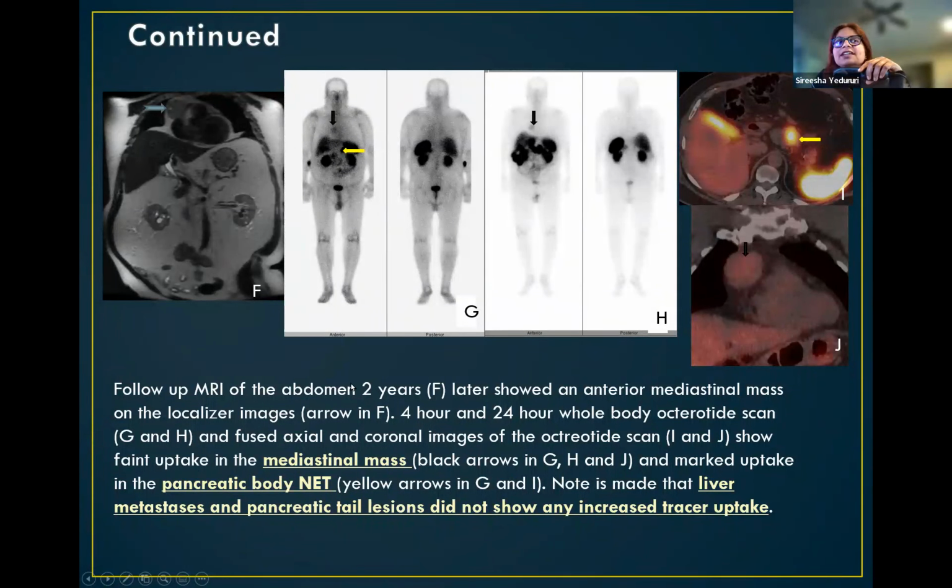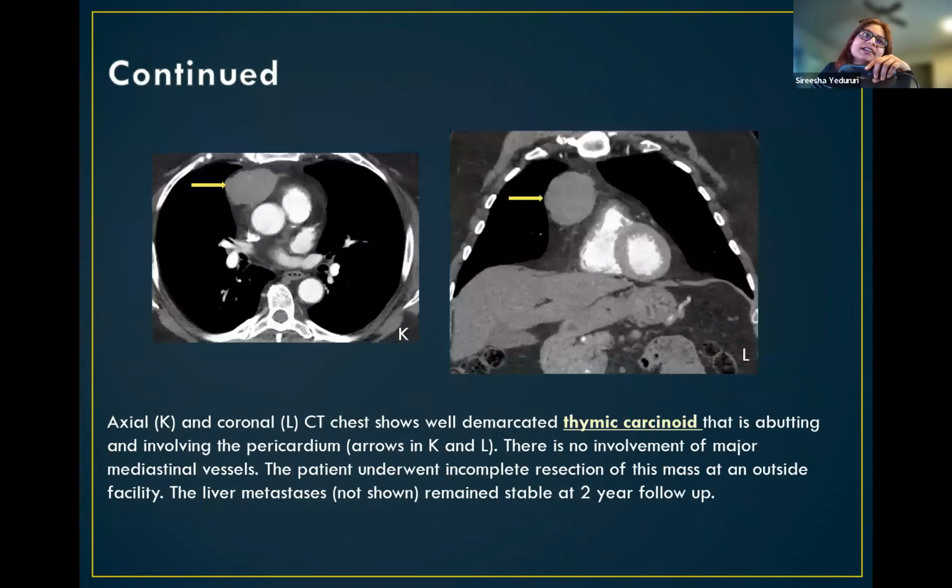So again, each imaging modality has its own advantages and disadvantages, and depending on whether they're functional or not, not everything will be picked up on each modality. So this is the thymic carcinoid. This was resected.